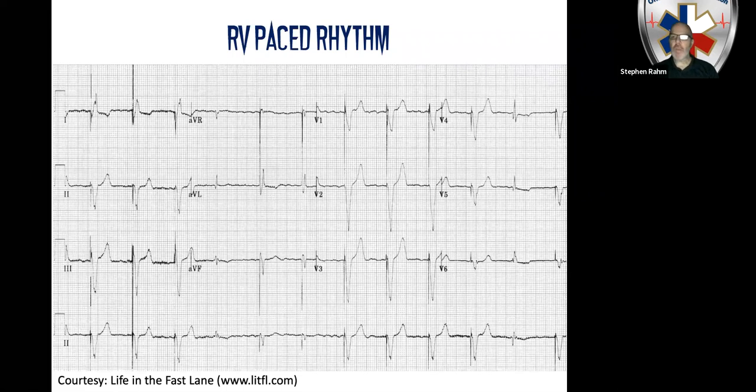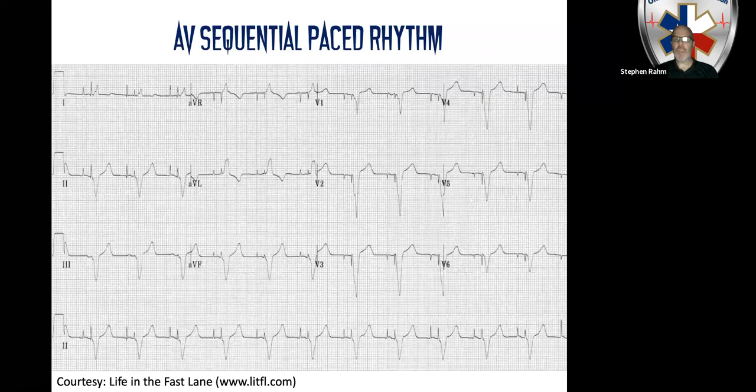And we've historically been told that with left bundle branch blocks and with paced rhythms, you cannot diagnose a STEMI. And I will tell you that it can definitely confound the underlying diagnosis because you expect to see some ST elevation in those leads. However, it's not impossible to unearth an underlying STEMI with either a left bundle branch block or a paced rhythm. Here's another example of a paced rhythm.